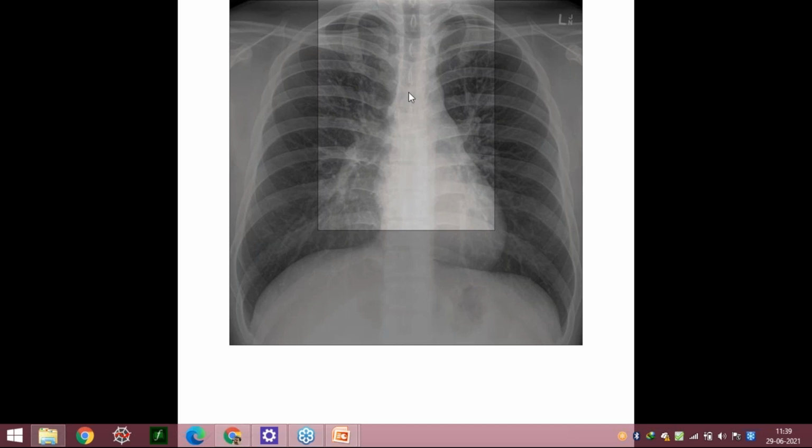So airway is seeing the trachea, seeing the divisions, and seeing whether the trachea is in the midline, whether there is some deviation, some pulling towards or pushing the trachea away, whether the division between the bronchi is equal, and whether the carinal angle is fine or not. Is there narrowing seen? Because if, let's suppose, there is a mass growing near the right main bronchus, you may see a narrowing of the bronchus. So this is what the airway majorly consists of: the trachea and its major division into the bronchi.